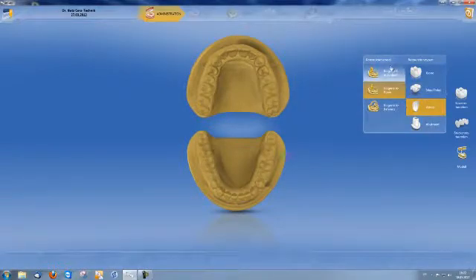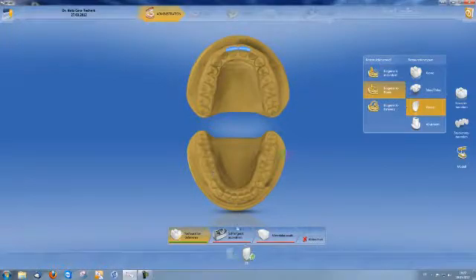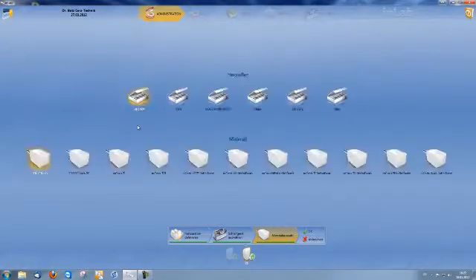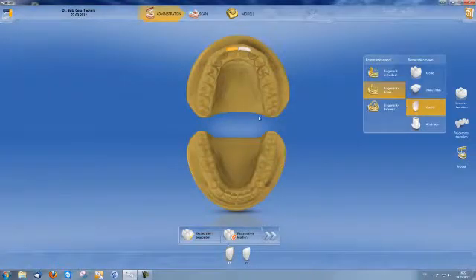and we design the veneer using the wax-up, i.e. the biogeneric copy. I click on the relevant restorations, select the milling device and the material to be milled, feldspathic ceramics polychromatic, and confirm by pressing OK. I then focus on scanning.